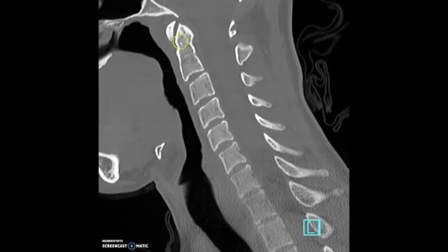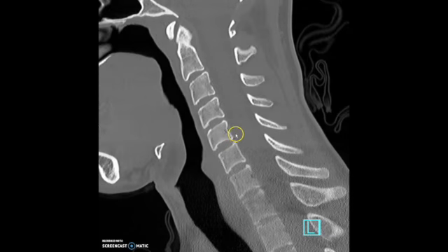And also, again, just practice figuring out which vertebral body you're at. Every time you open a cervical spine, try to name C5, and you'll see over time that you get better and better at it, and soon you won't need to count.